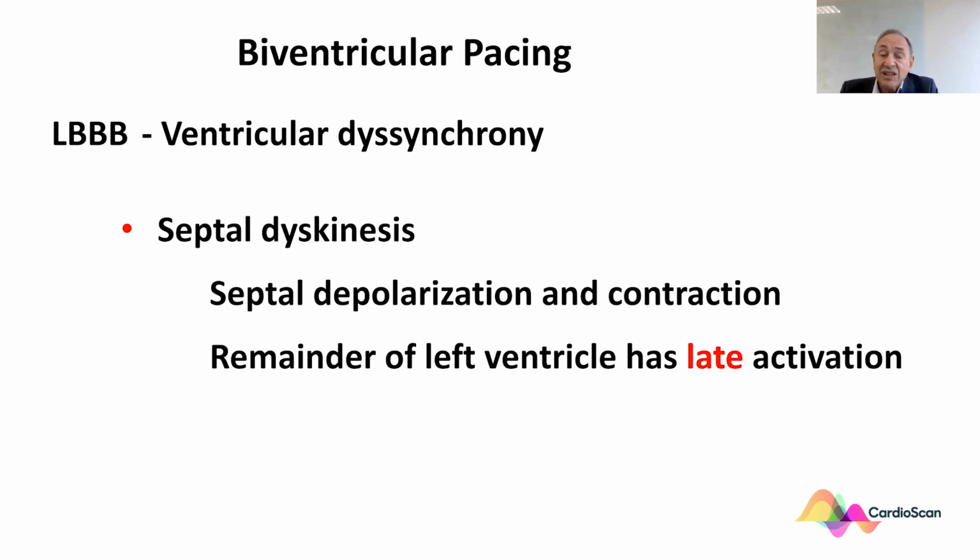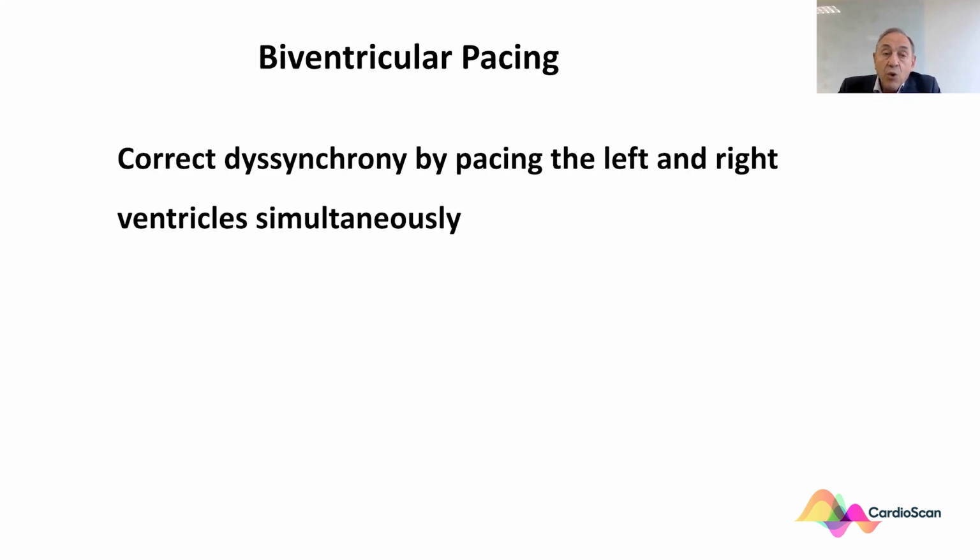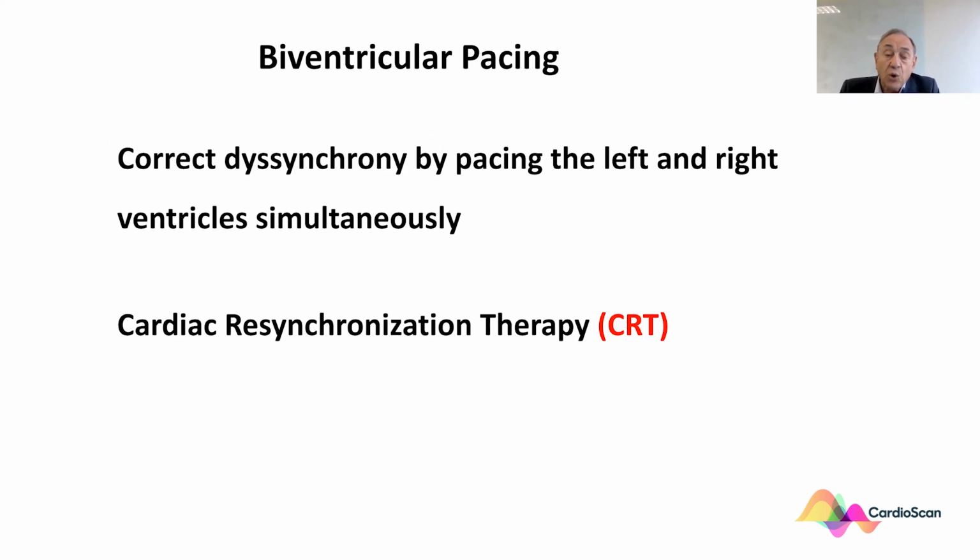And this is essentially a swinging movement rather than a contraction. And therefore, this is a mechanical reason for why the ventricle does not contract. The echocardiograph shows paradoxical septal motion. We correct the dyssynchrony by pacing the left and right ventricles simultaneously. This is called cardiac resynchronized therapy, or CRT.